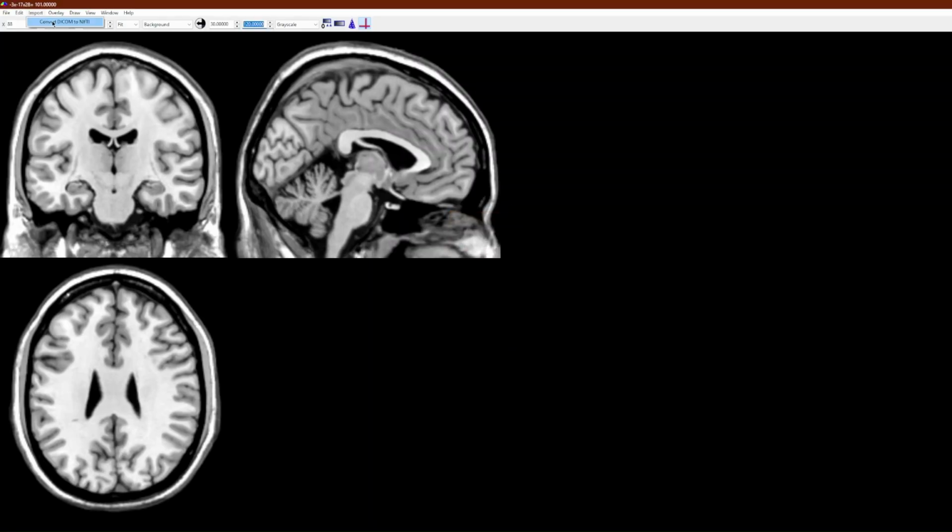One of the other important tools is convert DICOM to Nifti. This is often useful. It's also in MRIcron GL. And you can undo or copy or paste any changes you want as well. So you can save the file as a Nifti after you're done editing, or save it as a bitmap.